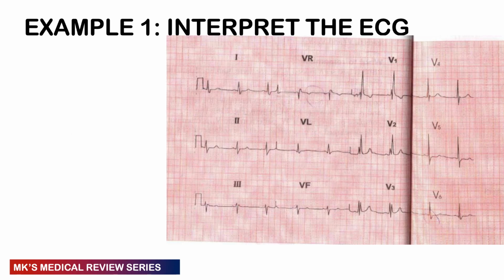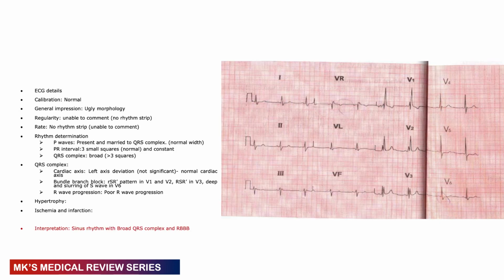So now, I will give you 3 examples that I want us to work through. Here I want you to interpret the ECG. You may pause the video, zoom the screen, and enhance the quality on your video so that you can have a good overview of how to interpret the ECG. So you may pause the video at this particular moment. And remember, if you don't practice these things, they're not going to stick. You won't understand what is going on. So here comes the answer.